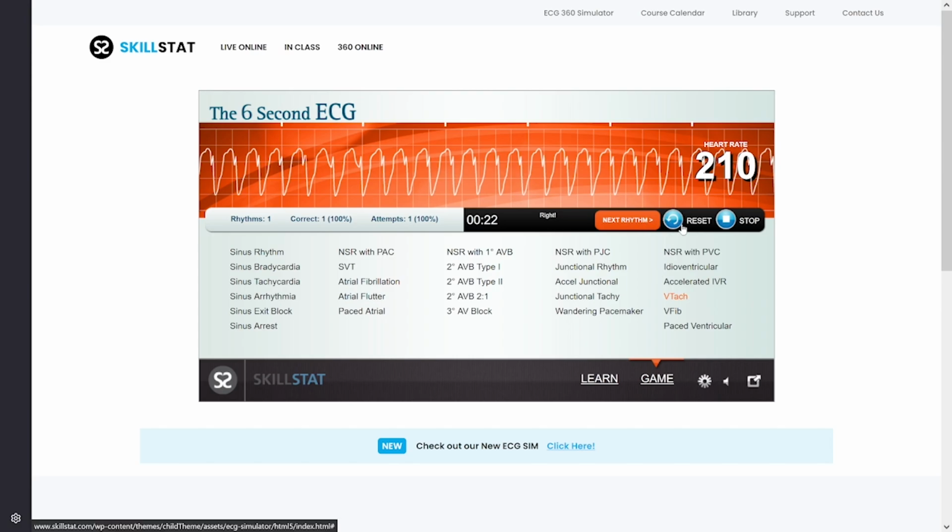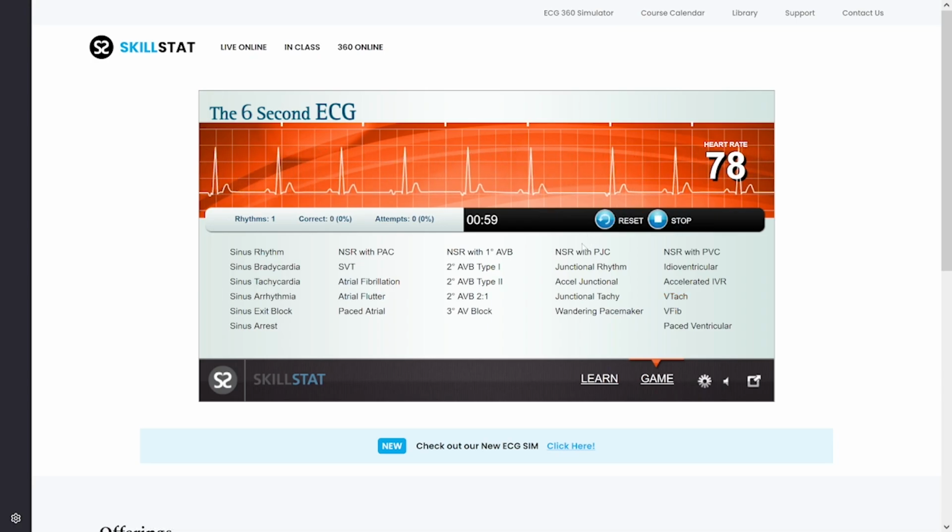But we'll go ahead and do our, I want to say this is going to be our last rhythm. Let me check something. Maybe we got about another 1 or 2 rhythms left in us. So we're going to go ahead and start again. Now, what is this rhythm? I'll give you a moment to think about it while I walk away to drink some water.